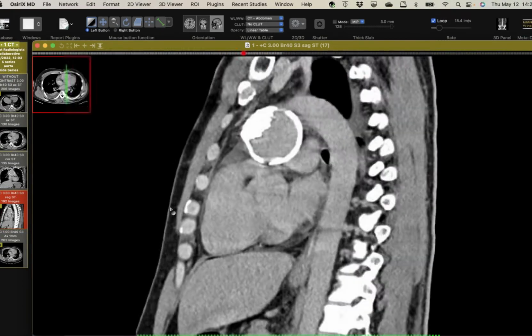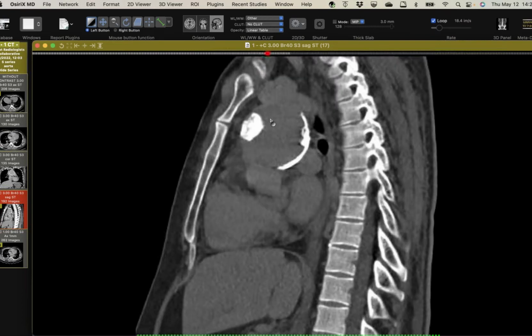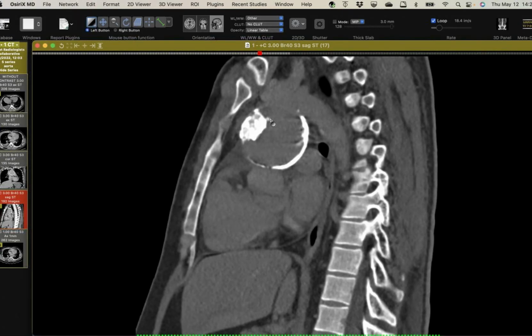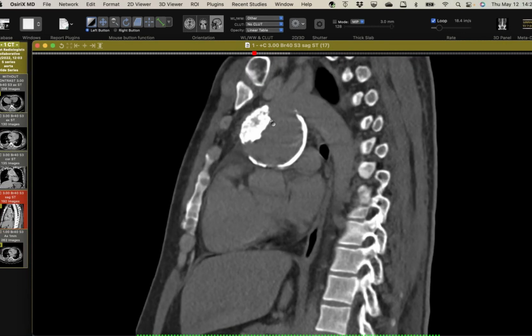So I don't have a definitive answer, but it would not surprise me if this is related to syphilis. There's no history of aortitis otherwise, no connective tissue disease. And I know David has shown some cases like this before, and I remember learning this from him. It often gets this really thick, sometimes bark-like calcification from syphilis causing an aortitis in the ascending aorta, because most of the time, most people, even with bad atherosclerosis, have less ascending aortic involvement, or if they have it, it's diffuse. And given the lack of atherosclerosis anywhere else, and I want to say this guy was like 30, I suspect this probably is syphilis. I don't know if you have any other ideas or comments, but that would be my leading diagnosis.